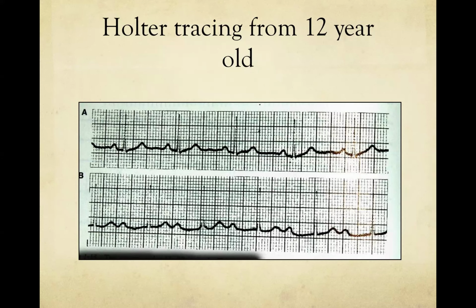Why do you say that? Because the PR interval appears to be very long. It's 1, 2, 3, 4, 5, 6, 7, 8, 9, 10. So it's almost 400 milliseconds, right? Yeah, it's almost 400 milliseconds. It's on the very long side.